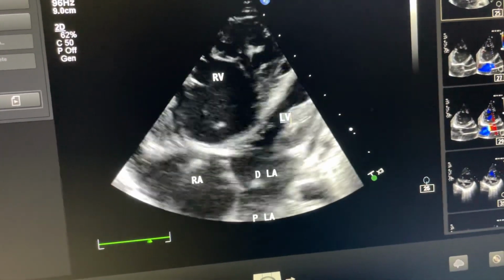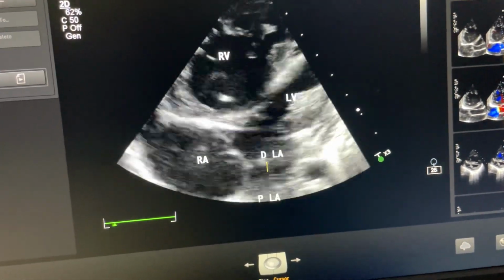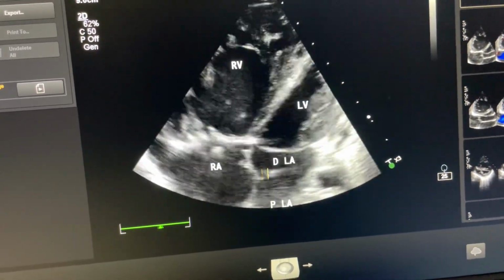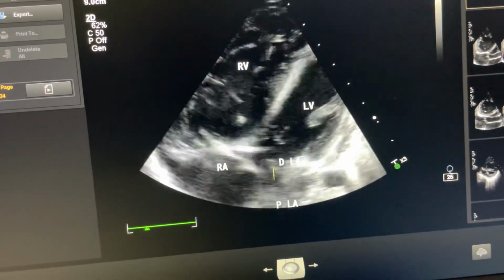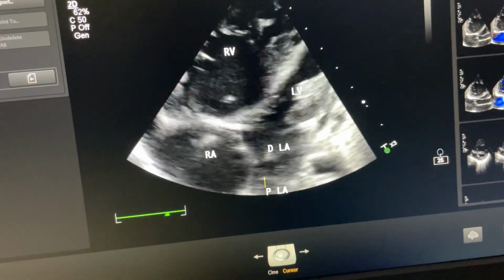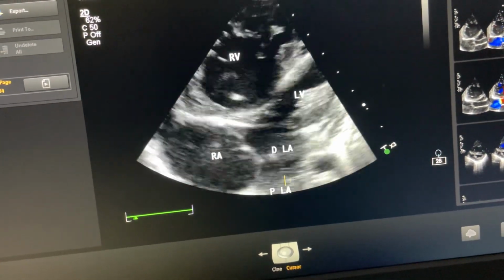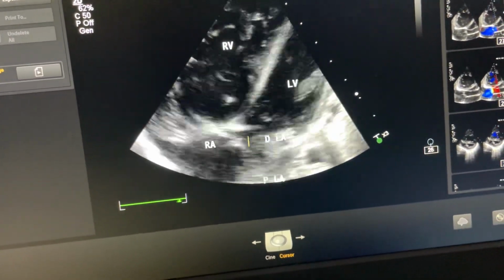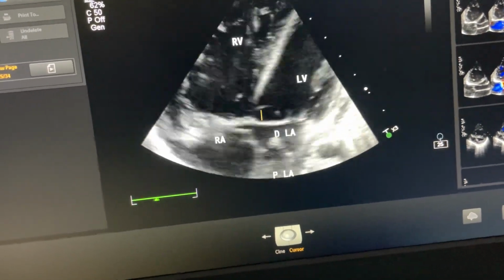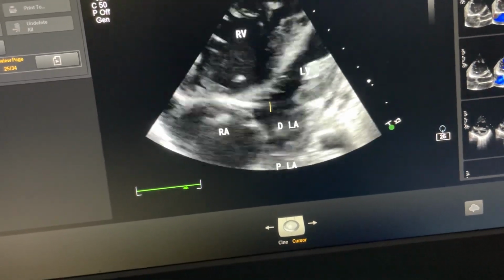Congenital abnormality you see in this case, the finding is this: septum is quite large and a very small perforation is present between these two chambers, proximal and distal chamber, and that is obstructing the flow. And because of obstruction, the proximal left atrial chamber has got obstruction, that is reflected in pulmonary vein, then pulmonary artery, then right ventricle, then right atrium. So like mitral stenosis, what you see: left atrium enlarged, right ventricle, right atrium enlarged, pulmonary artery hypertension, pulmonary venous hypertension.